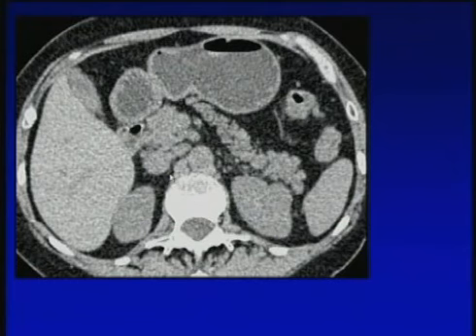Now, we recognize, of course, non-contrast CT has value in looking at renal masses, particularly for being able to diagnose hyperdense cysts. We also recognize that a non-contrast scan is very limited in terms of detecting smaller lesions. So one of the things we all recognize is that patients with hematuria get a stone protocol. We're always careful to comment that we can exclude an opaque stone, but we really can't exclude a small renal cancer as a cause of hematuria. And here's just a simple example.